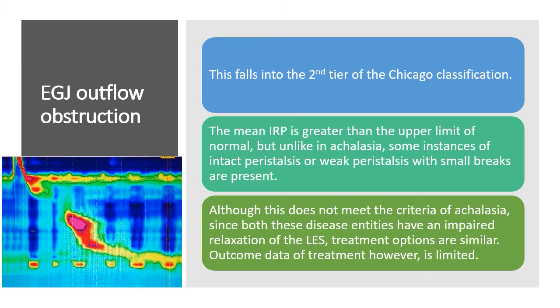Although this does not meet the criteria of achalasia, since both these diseases have an impaired relaxation of the lower esophageal sphincter, treatment options are similar. Outcome data of treatment, however, is limited.